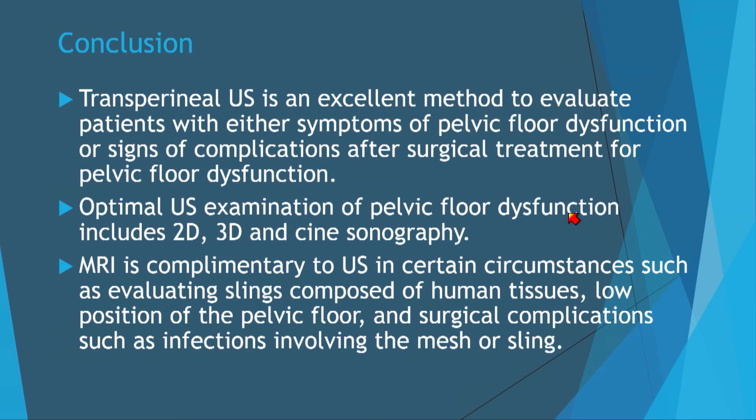Well, in conclusion, I hope I've shown that transperineal ultrasound is an excellent method to evaluate patients with either symptoms of pelvic floor dysfunction or signs of complications. The optimal ultrasound evaluation does include, besides 2D ultrasound, 3D ultrasound and cine sonography. And finally, MR is complementary to ultrasound in certain circumstances, such as slings composed of human tissues, low position of the pelvic floor, and certain subtle surgical complications.